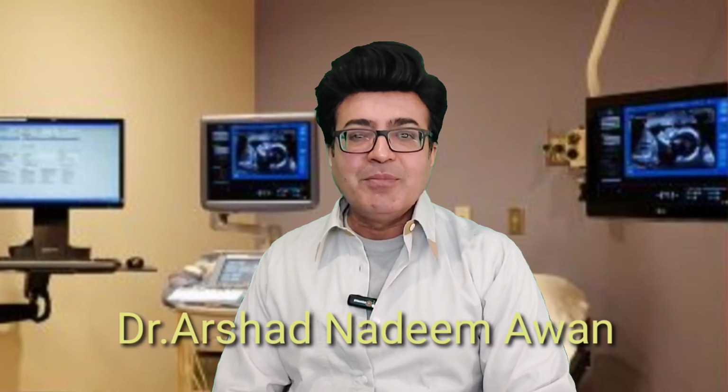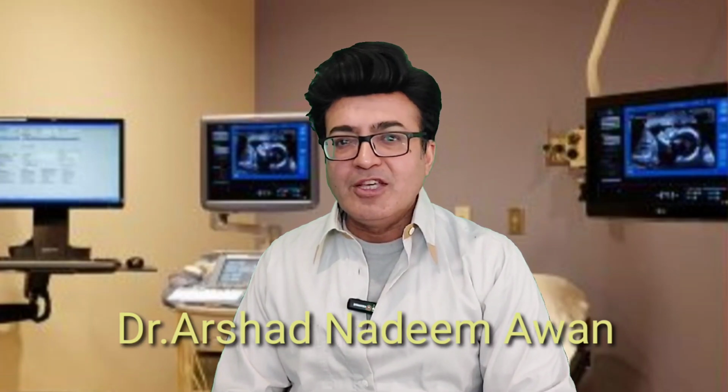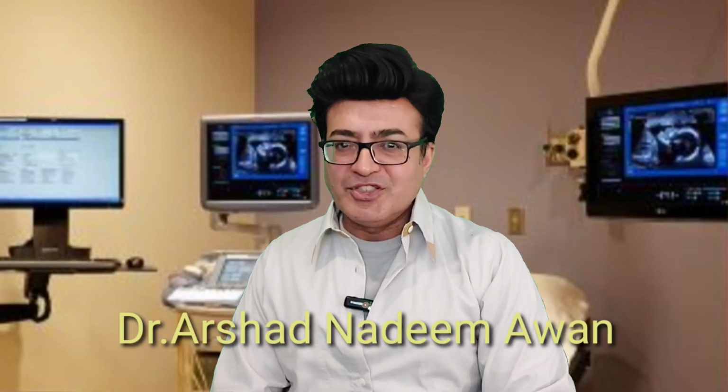Today my topic of discussion is secretion within the uterus and secretion within the vaginal cavity. There are a few terminologies we use. One is called hydrometria and another is called hydrometrocolpos or haematometrocolpos. Whenever there are secretions or fluid within the uterus, that would be termed as metro. And whenever there is a fluid or secretion within the vagina, that is called colpos. So we are going to discuss hydrometrocolpos and haematometrocolpos.